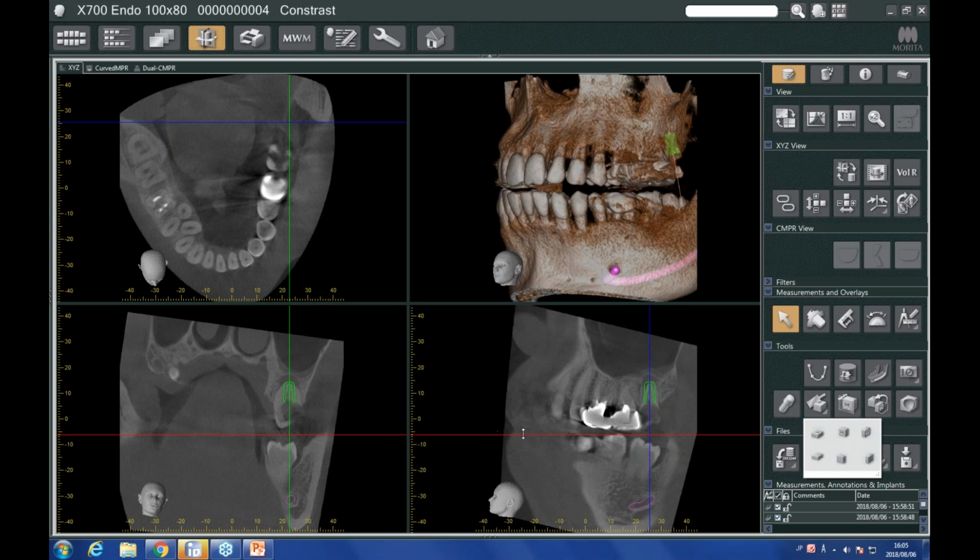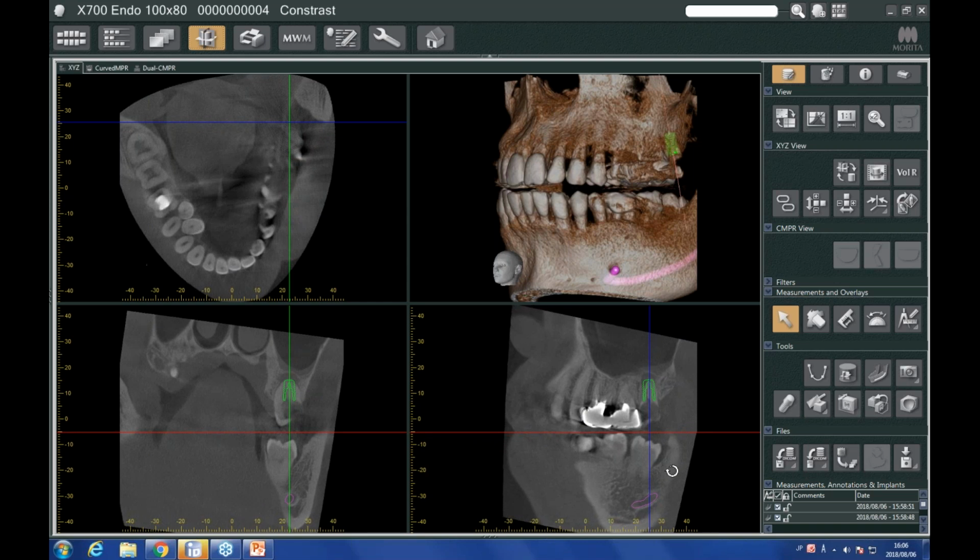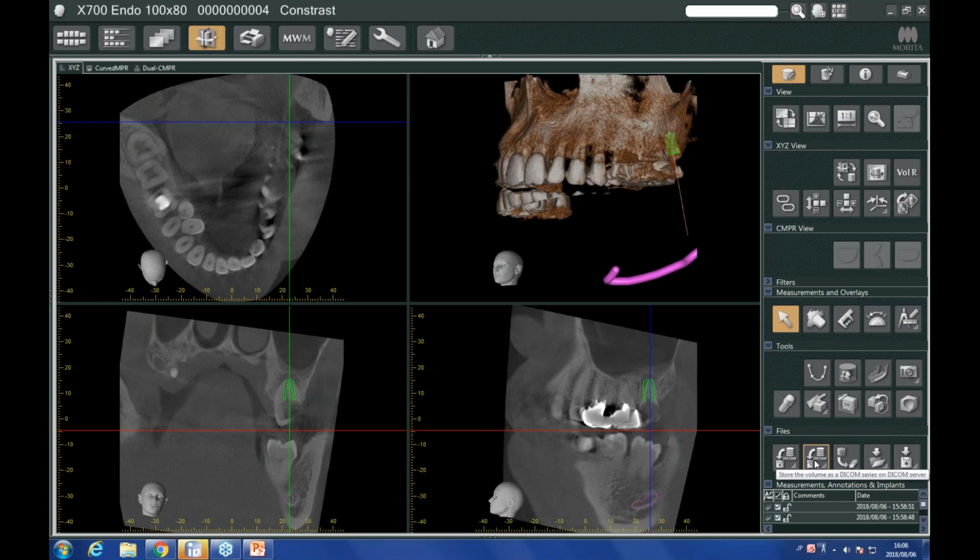It's going to cut wherever we set this red line. So if I rotate my volume in such a way that I can place this red line in the middle of the occlusion, then if I remove the mandible, all I need to do is click on my static slice and click on the button that shows the dotted line below. Now you can see the mandible is removed.